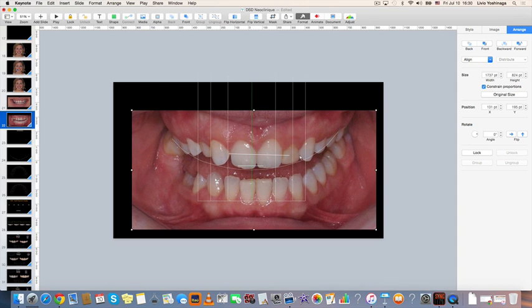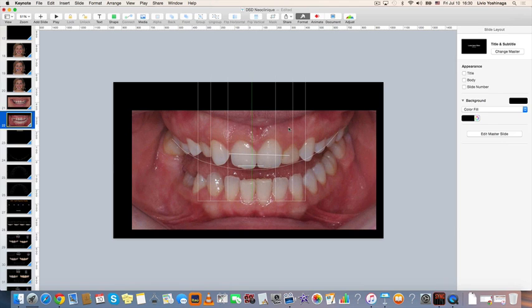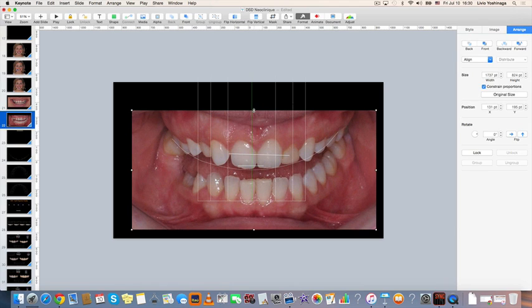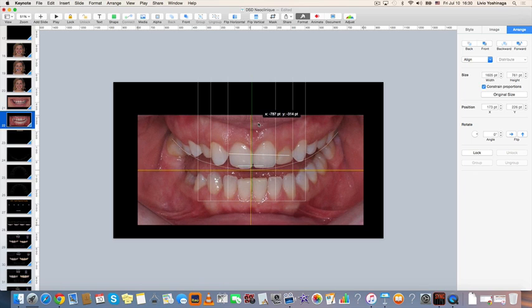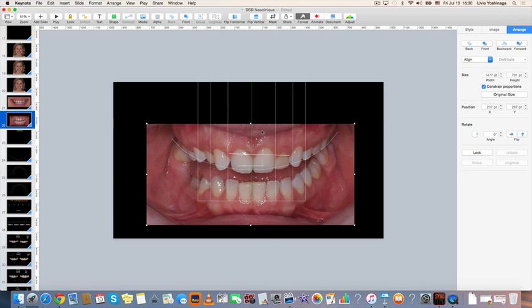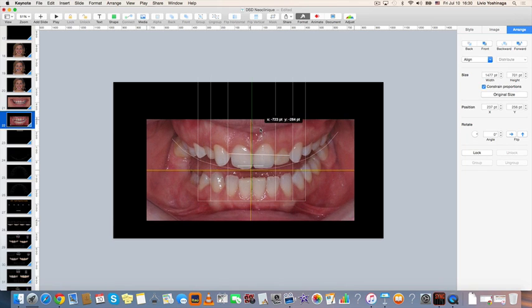This embrasures is way out here. If I don't remember the reference points, I come back here, I see this is my reference point, so this now is too big. So we're going to make this a little bit smaller until those embrasures fit. Now a little bit smaller, and probably this will be the situation here.